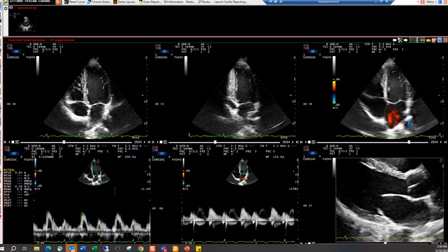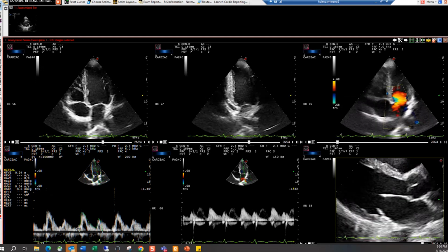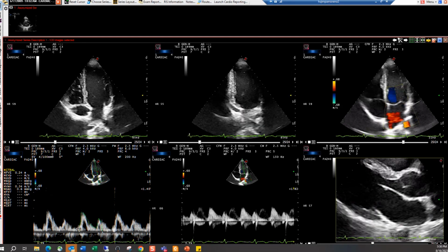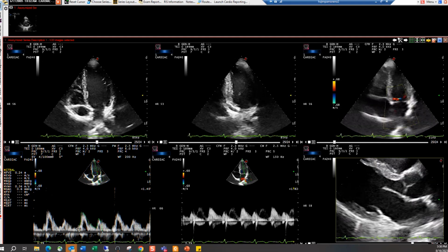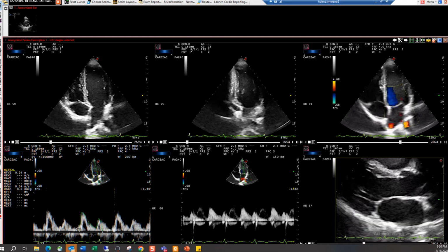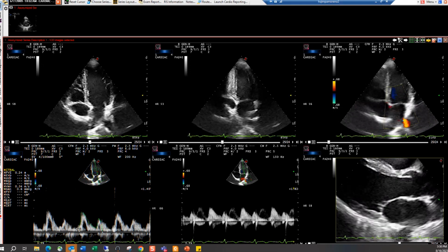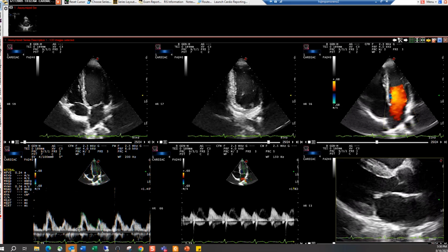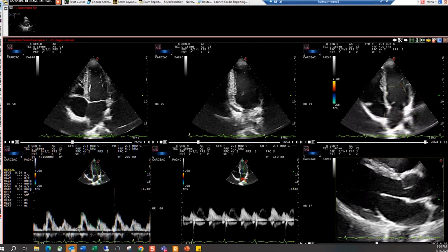I know there are tools within Encapture that we have developed to assist the team, such as gender-based measurements from ASE. You can hover over a field and it will show you what those specific measurements are for a male and female.